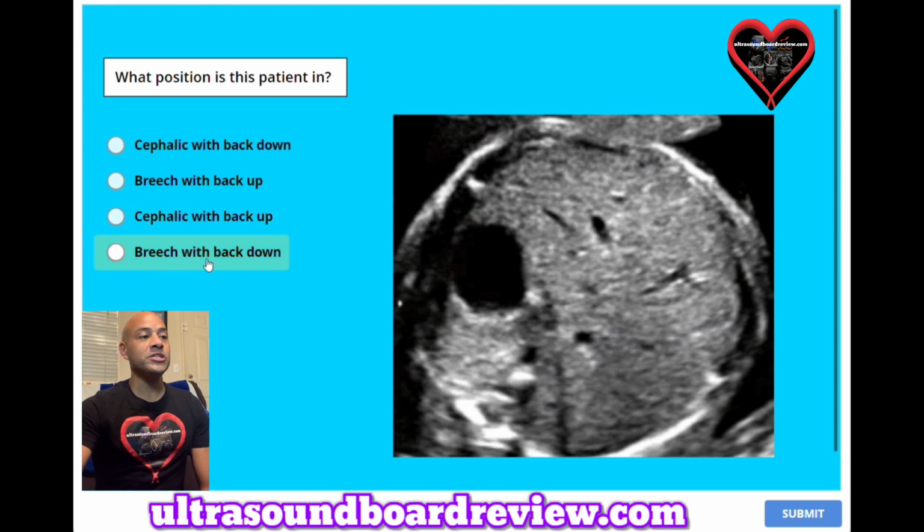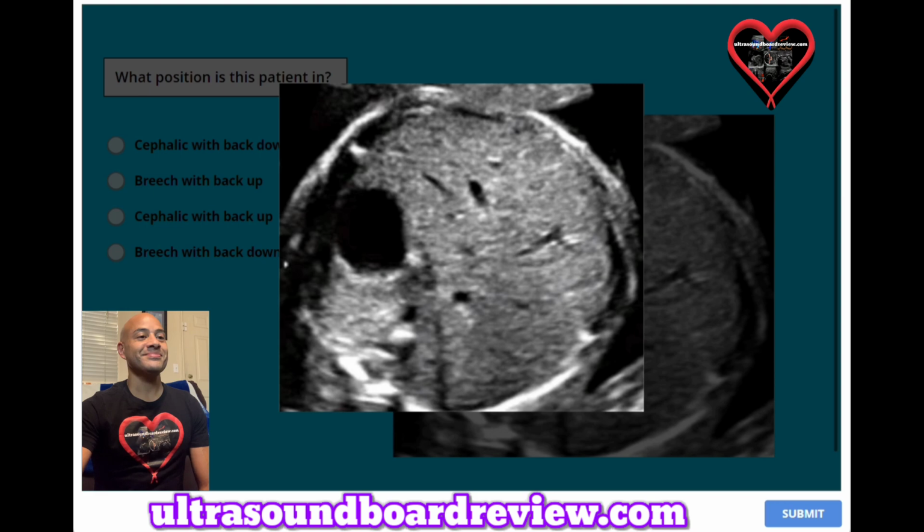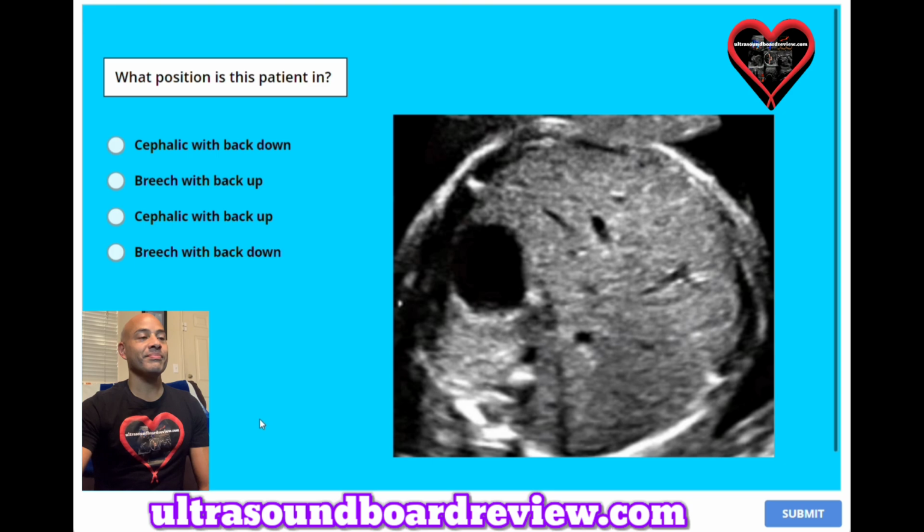Or D. Breech with back down. The answer is A. Cephalic with back down.